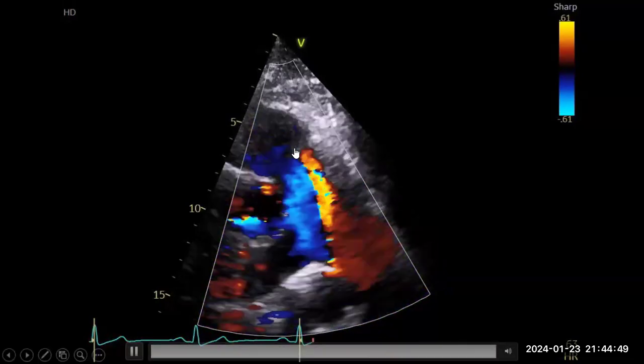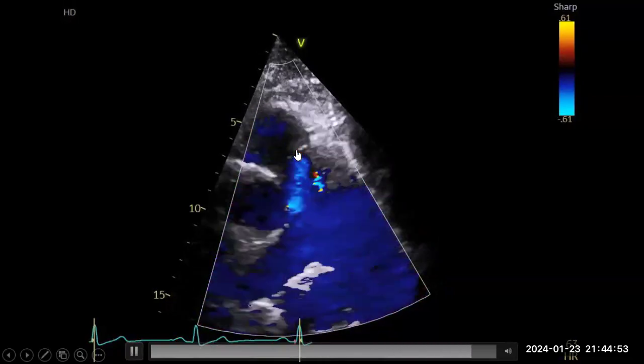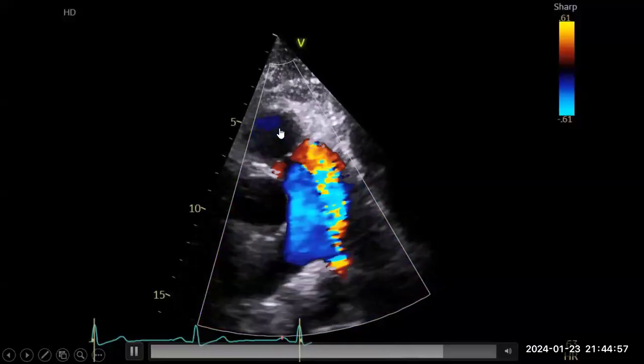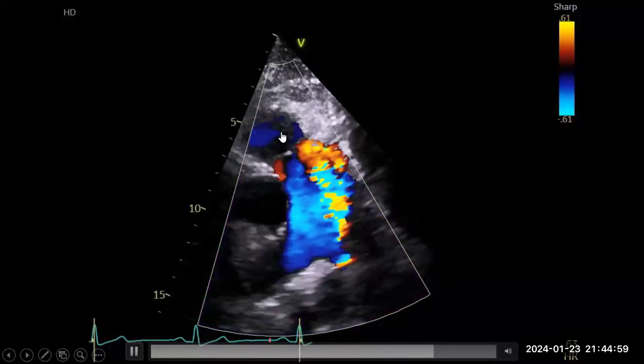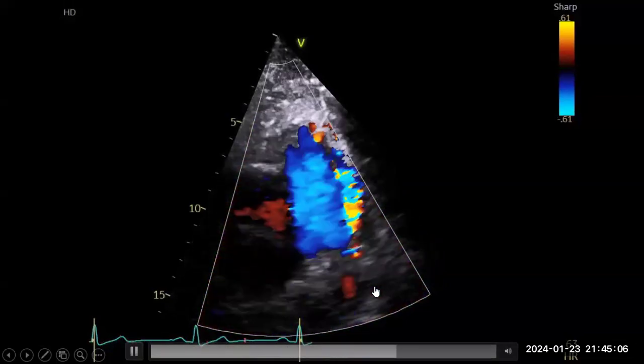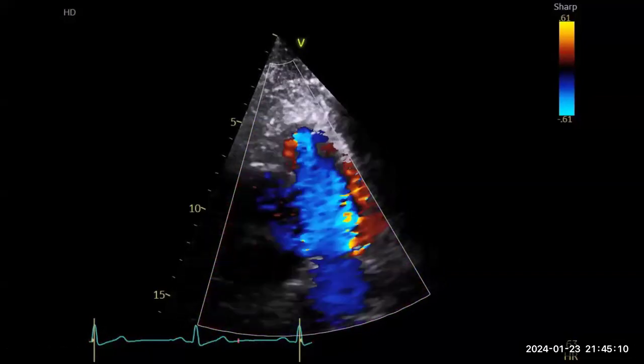It's continuous. And if this is the pulmonary valve, am I right? So it's opening. If there is a PS, you expect the turbulence to start from here, am I right? No, to be more central. Yes, this one is extending with uniform aliasing, so maybe there is a PDA. Okay, excellent. It seems that.